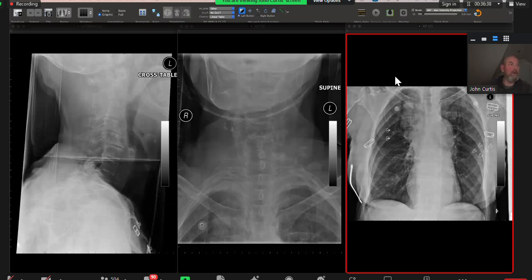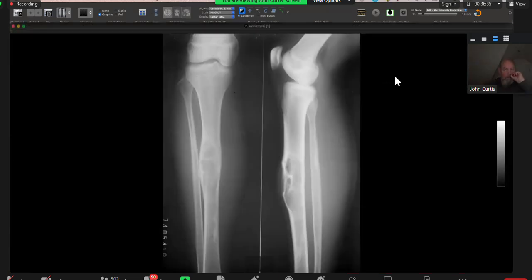Okay. Have a look at this one. This patient's got a swollen shin. I have been presented with frontal and lateral radiographs of the leg. There is no marker. However, I can see an ill-defined mass lesion in the shaft of the tibial bone. This mass lesion is causing expansion of the bone, and I can also see what looks like a soft tissue component in the lateral view.